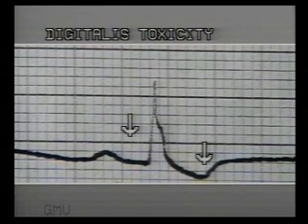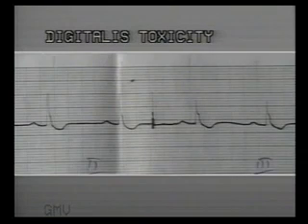In this ECG, note the characteristic ST depression with slow downward slope and steep upward rise. The T wave is flat and the PR interval is prolonged, indicating first degree heart block. In this ECG, once again, the characteristic ST segment depression of digitalis toxicity is seen.